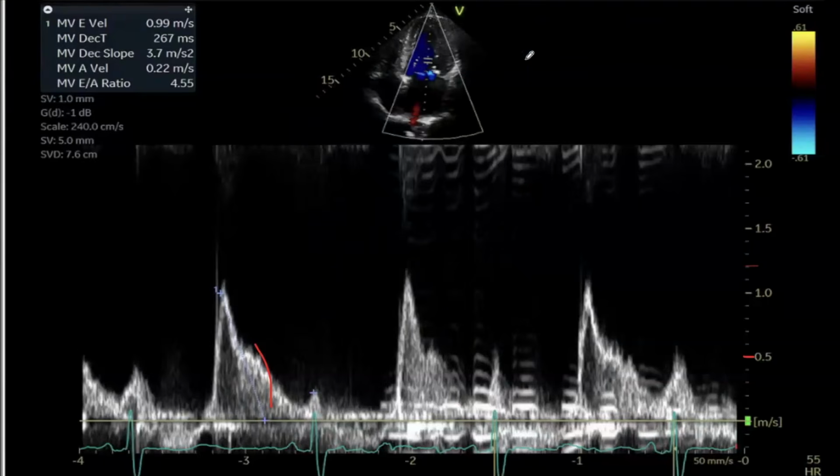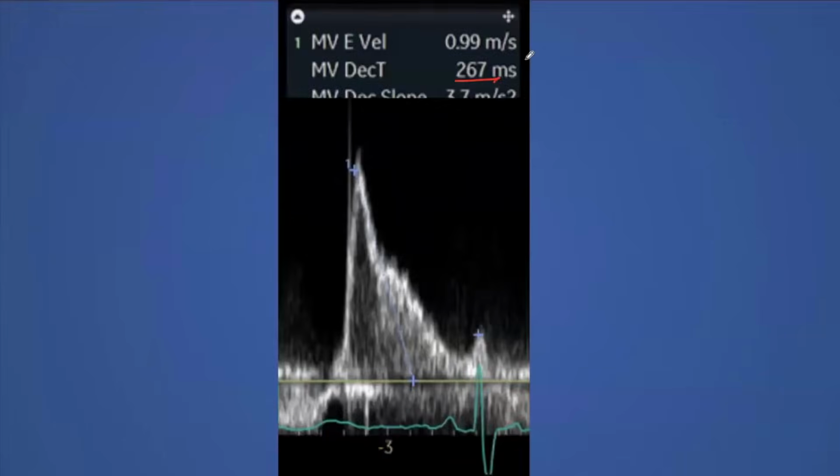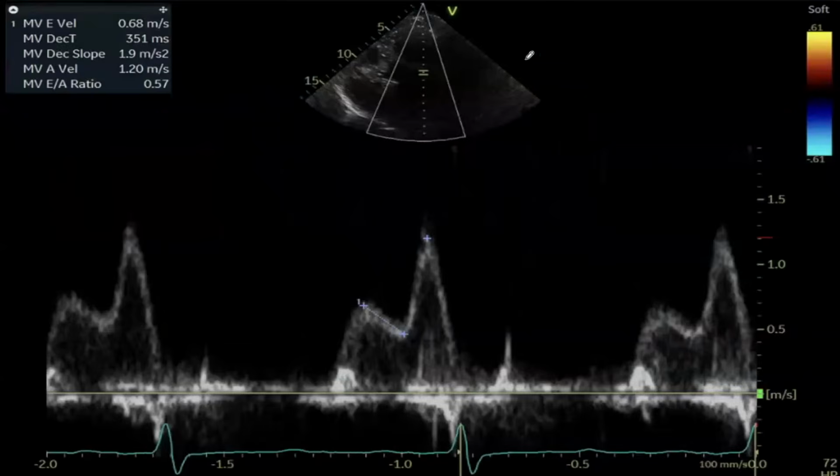And sometimes people will just follow the numbers. For us, in our setting, most of our patients come from other clinics, from other hospitals. We don't have the images. We just depend on whatever is in the chart. If they say the aortic stenosis mean gradient is 40, we will consider it 40. We don't know how they measured it, but we trust them, and we should have trust in our own measurements. How about this one?